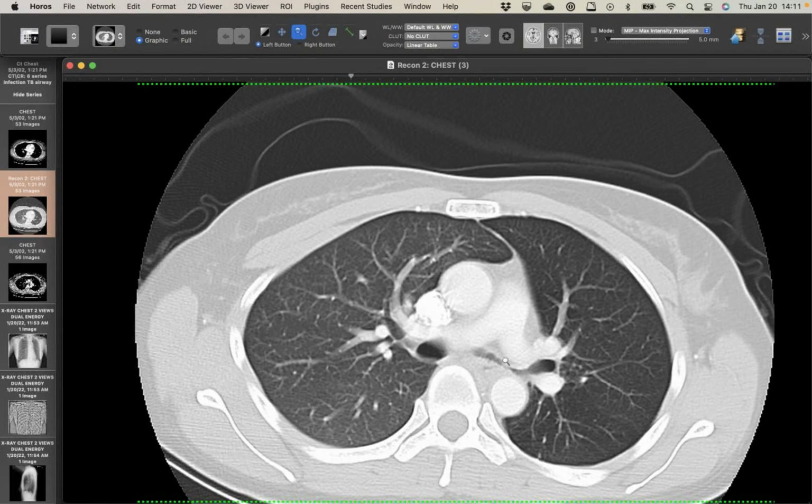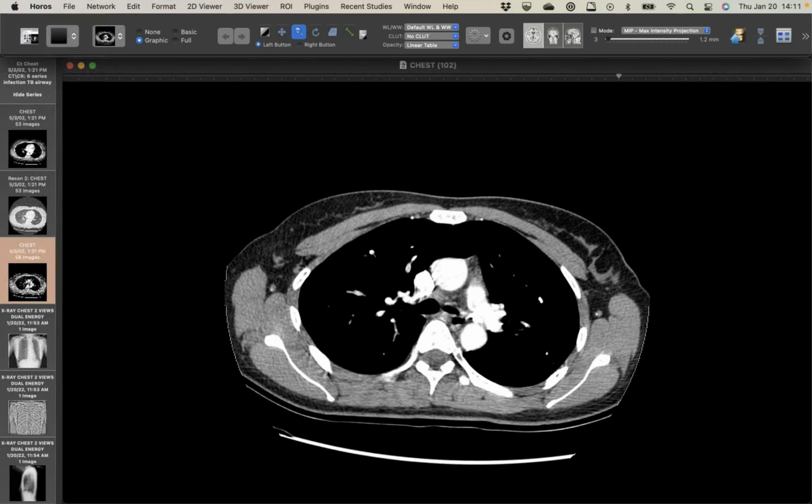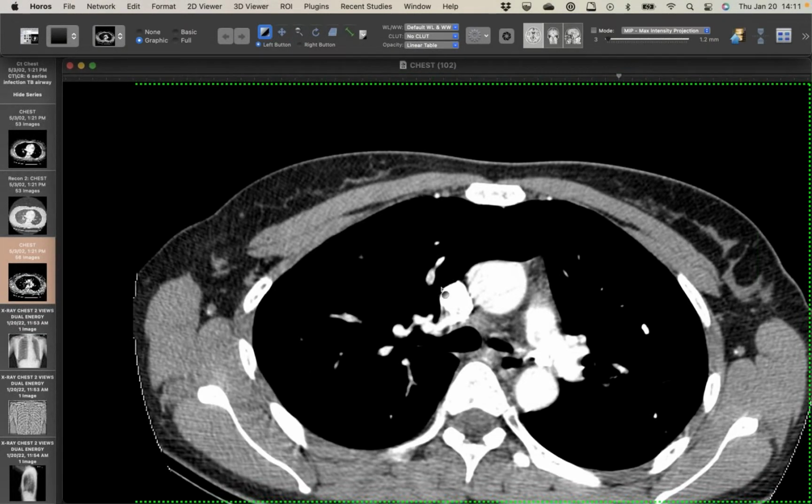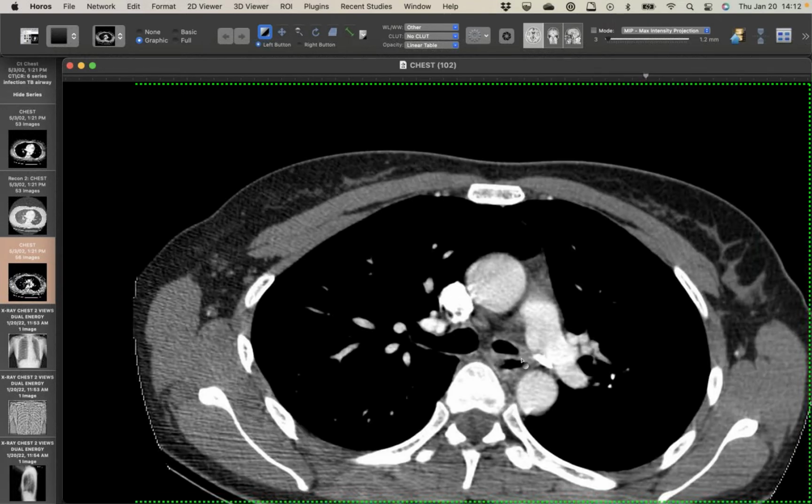I wish I had expiratory images, but we don't know what they show, related to bronchostenosis. And the cause actually is tuberculosis. He has a documented history of TB many years ago. And we see a lot of calcified nodules, lymph nodes, but I've seen only a handful of cases of airway TB, and this is an example.